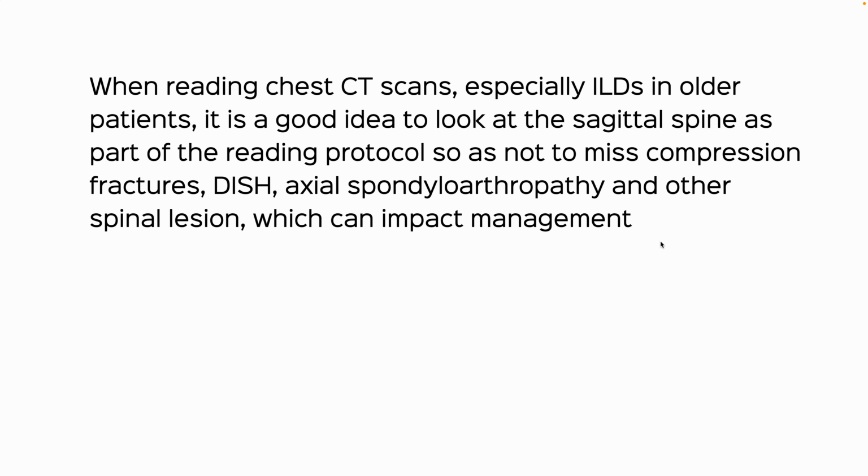So when reading CT chests, especially ILDs in older patients, it is a good idea to look at the sagittal spine as part of the reading protocol, so as not to miss compression fractures, DISH, and axial spondyloarthropathy, and then other spine lesions which can impact management. So that was the whole point of this, especially for radiologists who read CT chests.